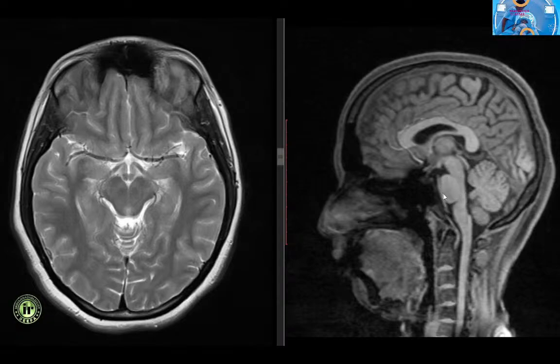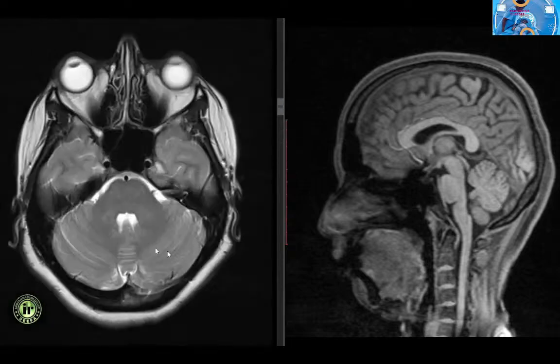The ventral portion is continuous with the cerebral peduncles of the midbrain and contains the corticospinal fibers. It mainly contains the transverse fibers which pass posterolaterally as the middle cerebellar peduncles. The dorsal tegmentum contains the cranial nerve nuclei of 5th, 6th, 7th and 8th nerves.